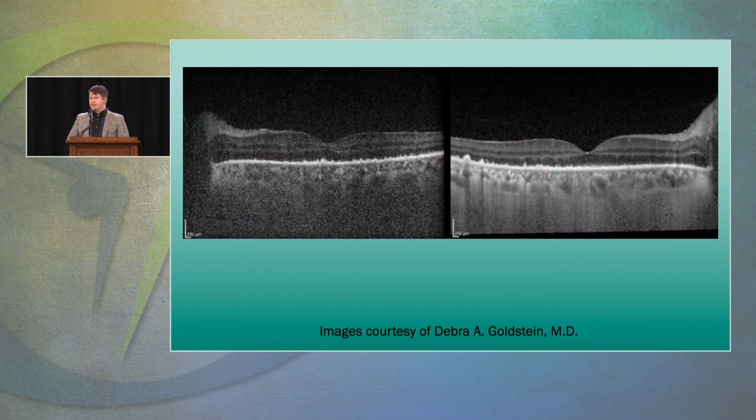And then these are the classic OCT findings of syphilis. They can be more prominent than that case that I showed you, with just a little bit of EZ-IZ irregularity. This is more of the outer retinopathy loss, where the EZ-IZ are nearly completely obliterated. It recovers very, very well with treatment. These patients go back to vision, as you know, back towards 20/20 if you treat them. So surprisingly, they can come in counting fingers with this total loss of outer retina. You give them penicillin and a little bit of steroids, and it comes right back. So something to look for.